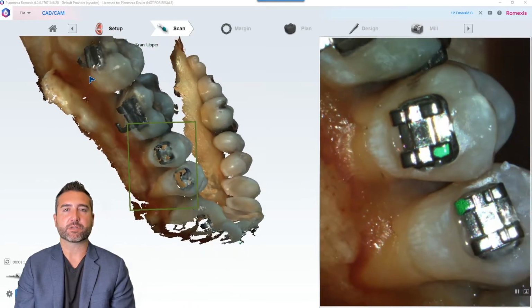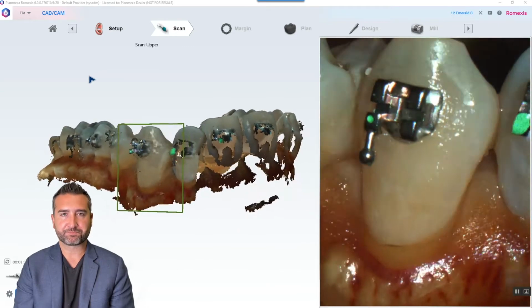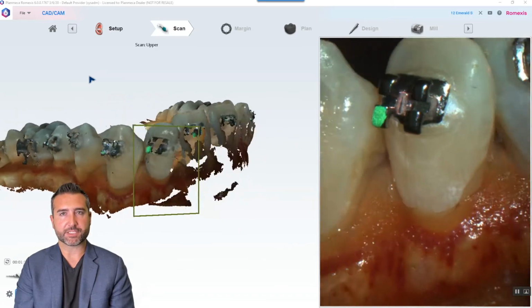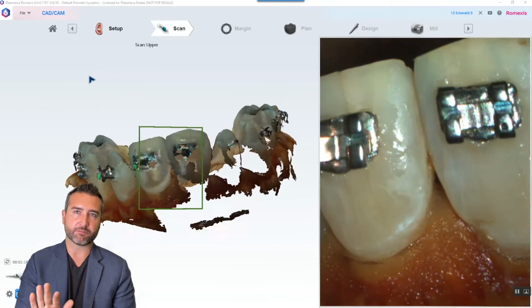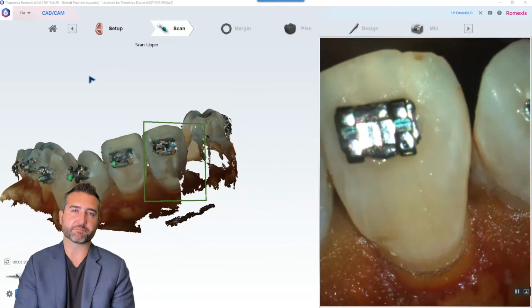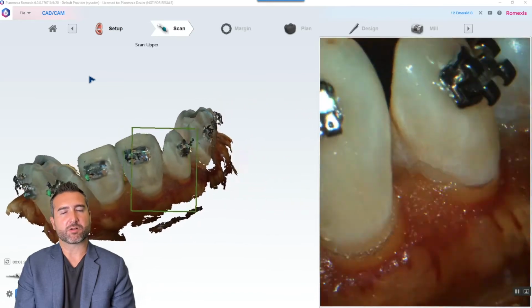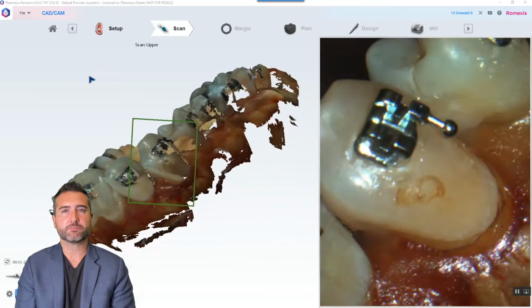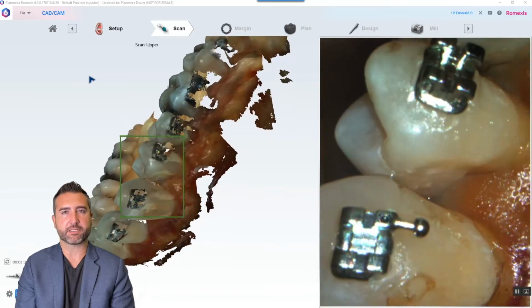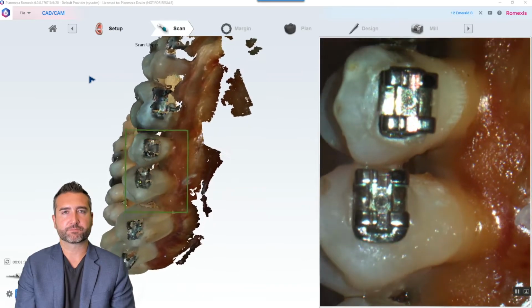So you can see here we're basically doing a lot of heavy rotations. And as we transition to the facial here, we're rotating in and out. Kind of the camera is like this, and we're rotating very much so to get around those brackets and those hard to get corners. Okay, so then we're on to that same 90-degree flat rotation for the posterior here.